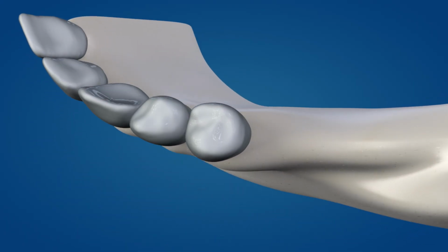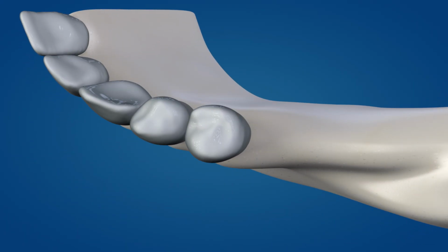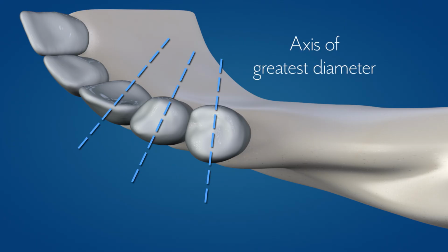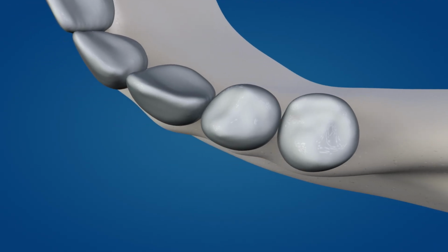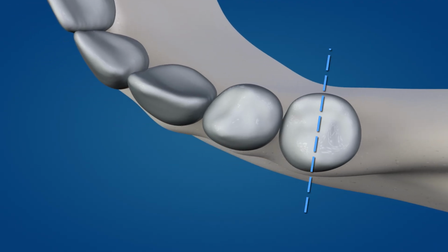In addition to the preceding considerations, one must understand that each abutment displays a facial prominence as viewed from the occlusal, and this facial prominence also plays a role in the mechanics. Focusing our attention on the contours of the abutment, we can appreciate those portions of the retentive arm located distal or posterior to this prominence will travel in an anterior direction and will exert a mesial force on the abutment.